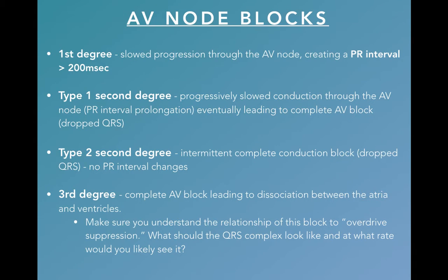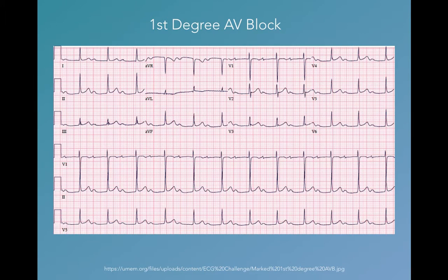So these can confuse people. They still confuse me from time to time if I'm not really thinking about a third degree block. But once you start to understand what they look like, then it becomes easier. So let's go through some 12-lead EKGs.